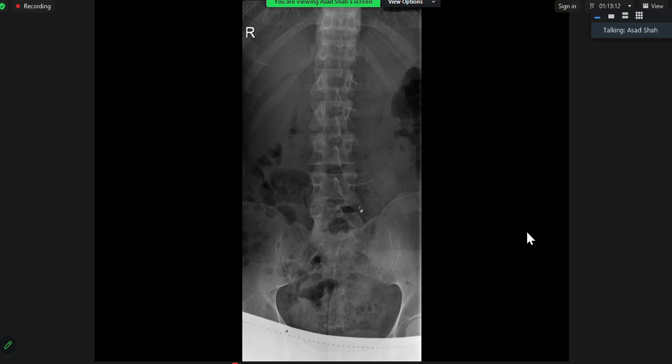I might have missed a few of these myself. So the pedicle is not there. What are the 2 differentials you'll be thinking about in somebody 40 years old? The contralateral is hypertrophied, so it could be congenital. Other differentials include mets.